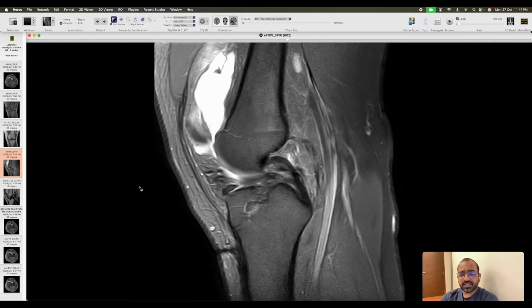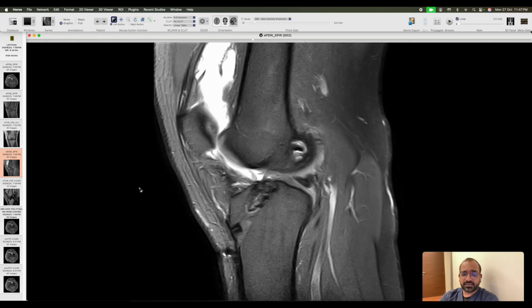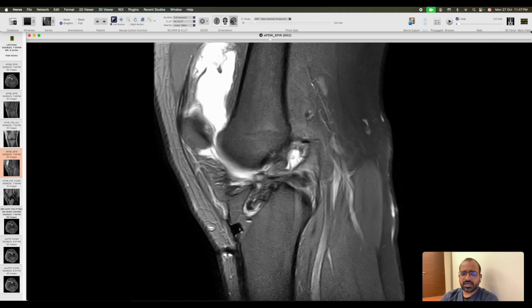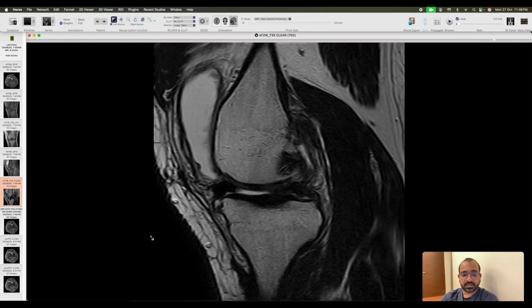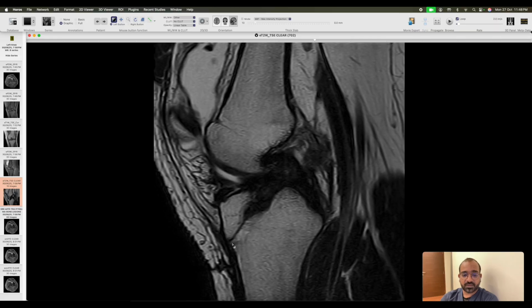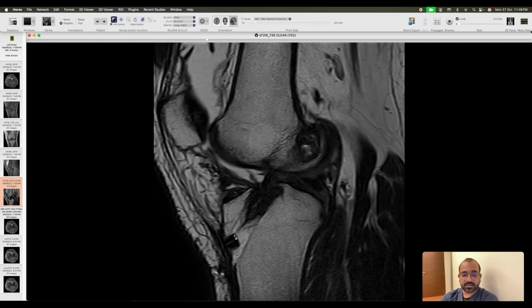It is almost completely torn, completely retracted. This tibial tunnel is normal only. The graft is attached with strings onto this endo button here. See, these are the strings attached to the endo button.